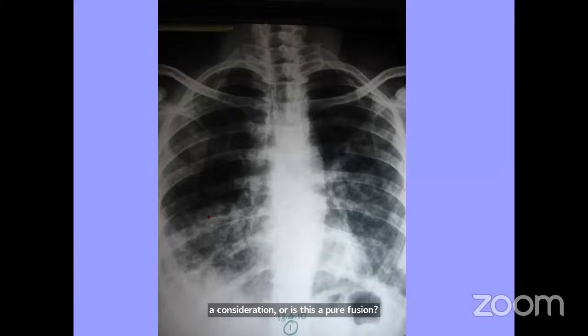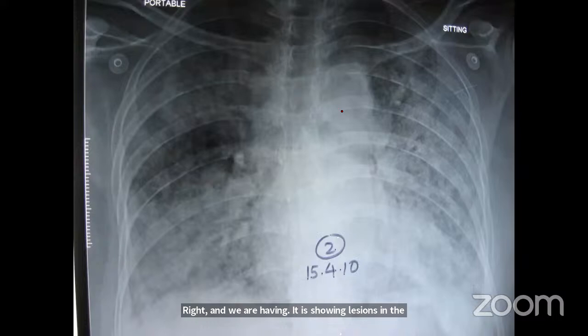Now, this is a lesion, as you can see, of a patient on 13/4, right? It is showing lesions in the right lower lobe, right mid zone and lower zone predominantly. However, the patient's chest X-ray taken just 2 days later shows widespread lesions all over the chest, and they have become more prominent.